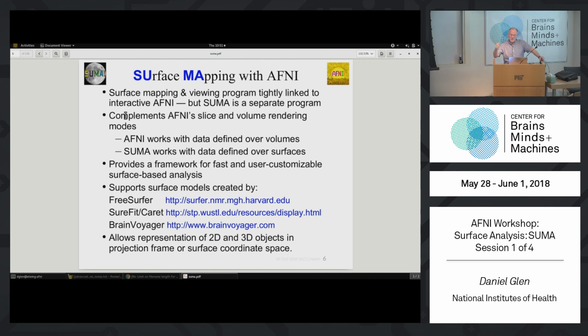And we have some tools for looking at the header of CIFTI data sets, but manipulating them is a little bit more difficult. It's a wrapper for NIFTI and GIFTI, and functional GIFTIs, which we'll talk about, which are like our NIML data sets. So the values that we'll assign to the nodes of a surface we put into a data set that we call NIML.dset, which can also be in a CIFTI or GIFTI format, the functional GIFTI format.